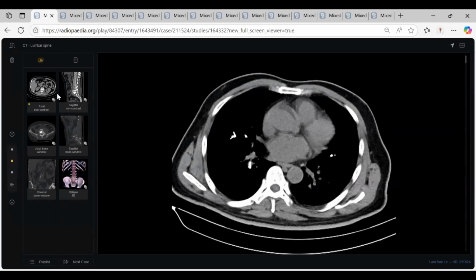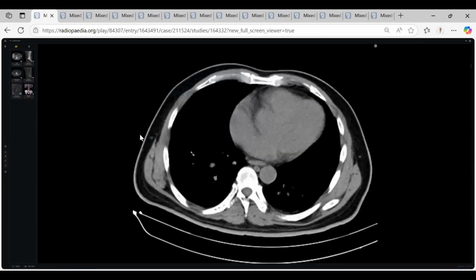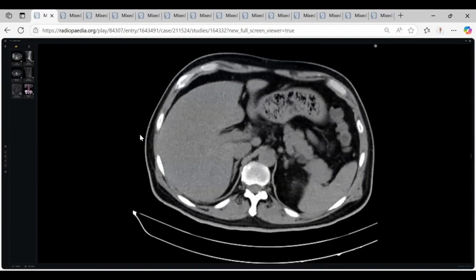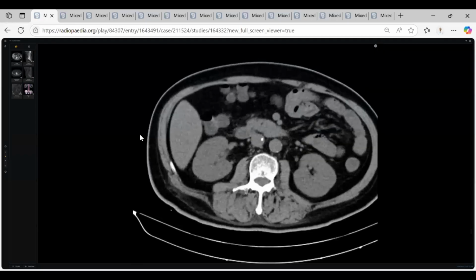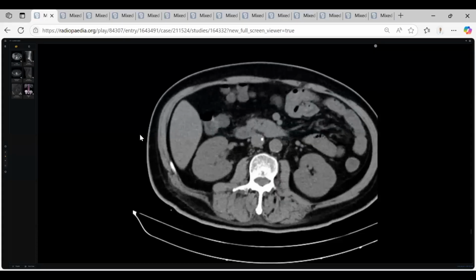Welcome. Hello, sir. Can you start for me? Yes, sir. Information disclosure: the patient has chest and abdominal pain. Okay, sir. I'm observing a CT scan study of an adult patient, chest and abdomen.